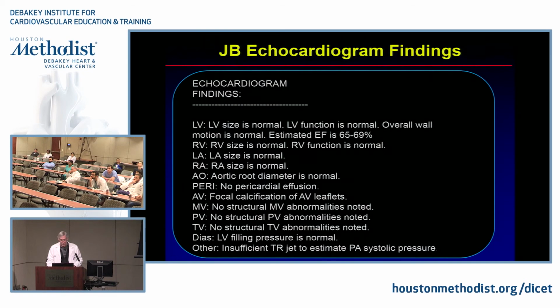And not to be remiss, the patient also, as everyone with a pulse, had an echocardiogram. So his EF by echo, you can see, was extremely normal, normal chamber sizes, no significant abnormalities. So I think it was a very nice case of where you can integrate different techniques to get a better feeling of how to treat someone.